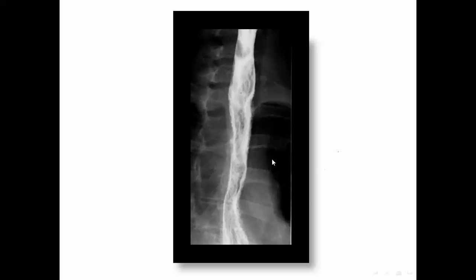In this one, the esophagus is not dilated, but the esophagus is showing spiky outline or hazy outline. Here are some spikes here. This is an esophagus which is affected badly. It could be candidiasis, it could be aspirin. Aspirin will produce such small ulcerations like that.